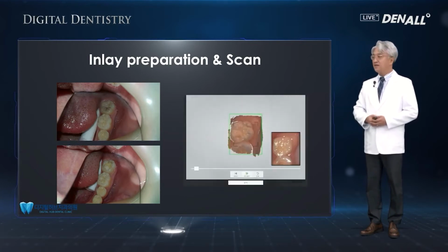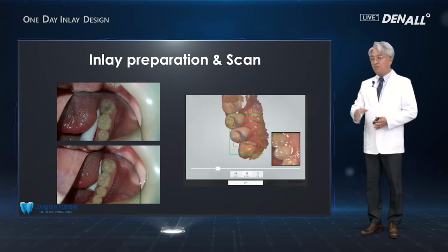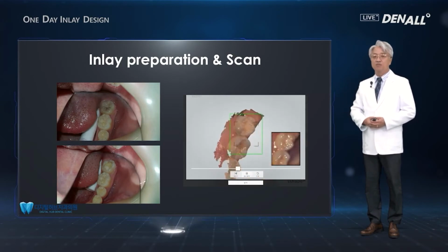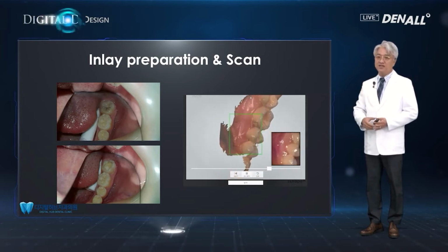But in the case of inlay, if you just do thorough scanning, then without much problem, you can do good prosthesis production.